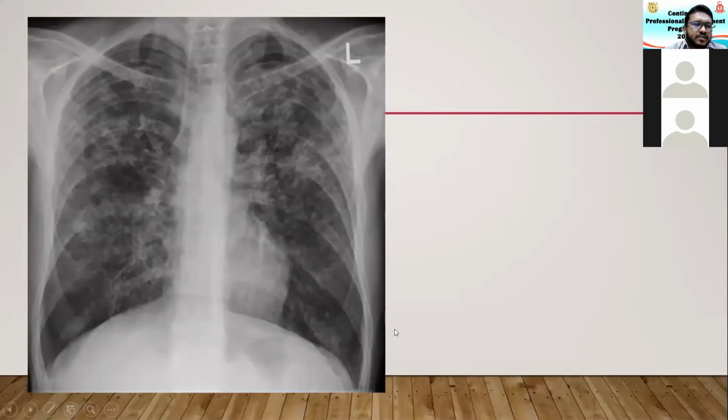Another common chest X-ray finding that you will come across in the OPD setting is in adult patients who come with SOB, worsening SOB over years, and who had some other underlying pathology, who have been on some treatment for other pathologies. You will see the interstitial thickening, and there are multiple fibrotic changes. It's not really volume loss, but you can see that interstitial thickening is there, not filling the airways here, but the interstitium is thickened. You can see there are streaky lines everywhere in the lung without any predominance.